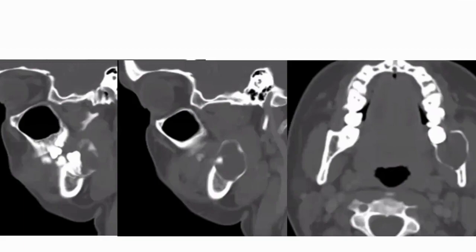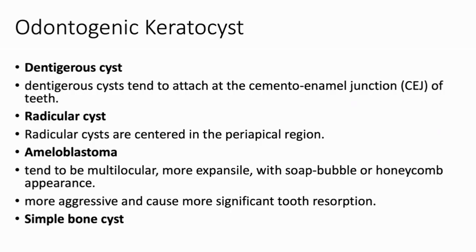Okay. I think your description is very good. And I think you also concluded with slightly cystic lesion in the mandible. So differential includes periapical cyst, as you mentioned. There are other differentials we can talk about. Dentigerous cyst is one of the differentials, but it is usually at the cemento-enamel junction in an unerupted tooth. Radicular cyst is another differential. Maybe this can be a radicular cyst because it is in the periapical region.